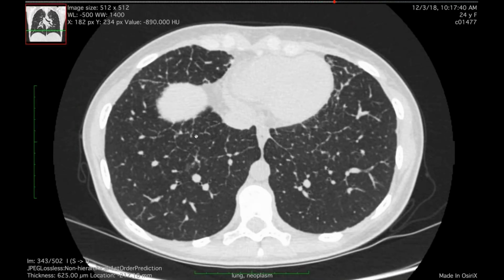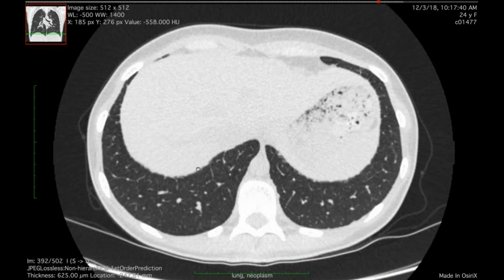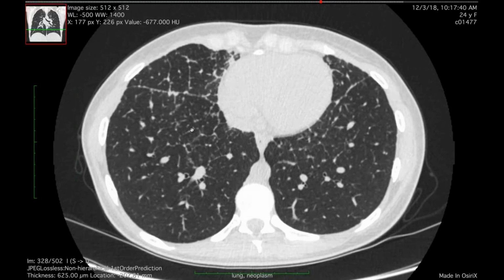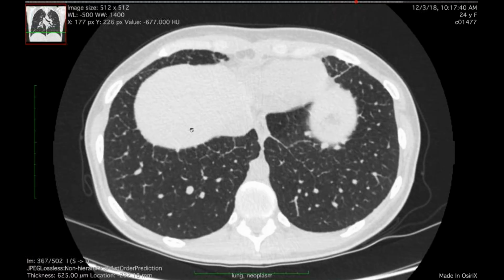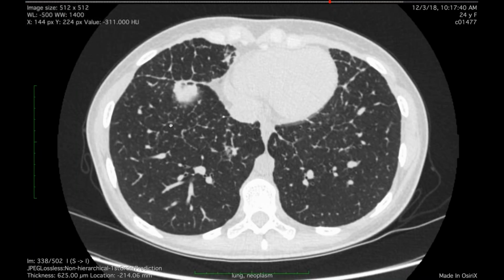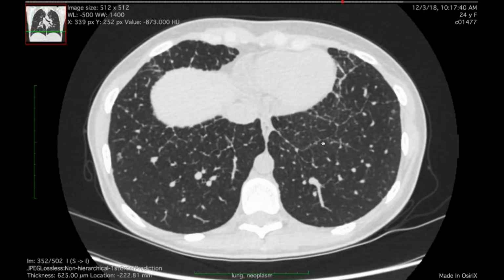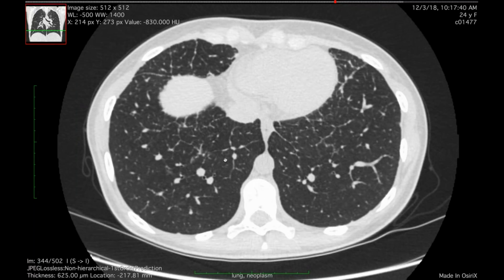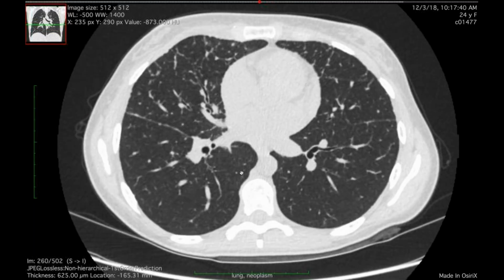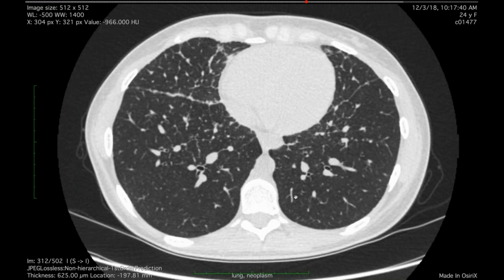And you can just see how you have these little beaded septae there, and just how it's slowly worsened over the course of several studies. I just show the oldest and the most recent one to show that. But I don't know, Howard, we've seen a couple of recent patients with lymphatic or venous lakes or lymphatic pearls from edema, but I think we don't always show just the classic cases that usually produce this, like lymphangitic spread of tumor. So this is all thyroid cancer, but just a really pretty example of nodular septal thickening. Yeah, very much so.